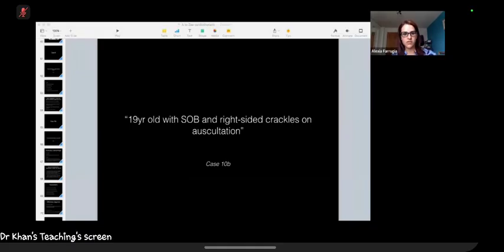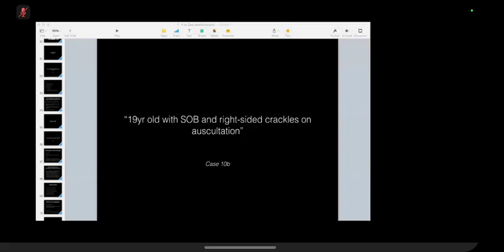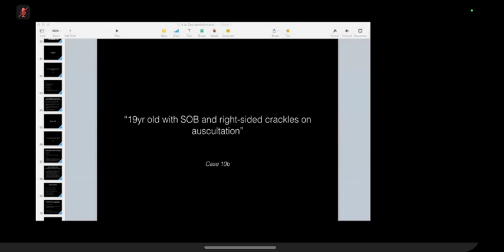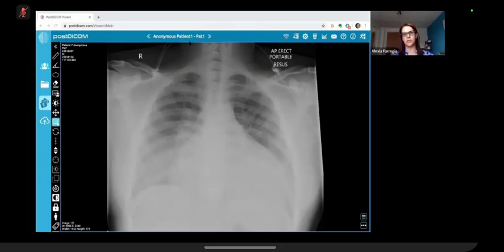So we'll start with his chest X-ray. Okay, so whenever you're ready, have a look. Again, I can't see the DICOM. I think it's only PowerPoint. Oh, that's okay. Apologies, sorry. Okay, can you see it now? No, I can still see the PowerPoint. You should be able to see it now. Yeah, I can see it now. Great, okay. So have a look, and whenever you're ready.